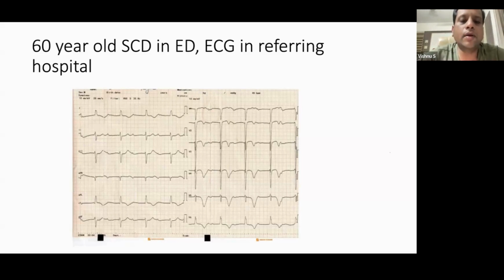Is it a complete heart block? For this complete heart block, is any ischemia pattern there with the QRS, or any other pattern with the QRS? In complete heart block we always look at the ST-T changes as well as T wave abnormalities. With these ST-T changes, you would think this is inferior MI. Is it inferior MI? This is not inferior MI.